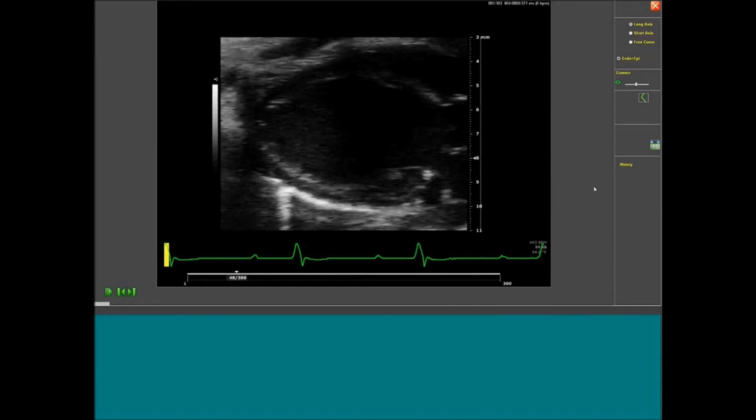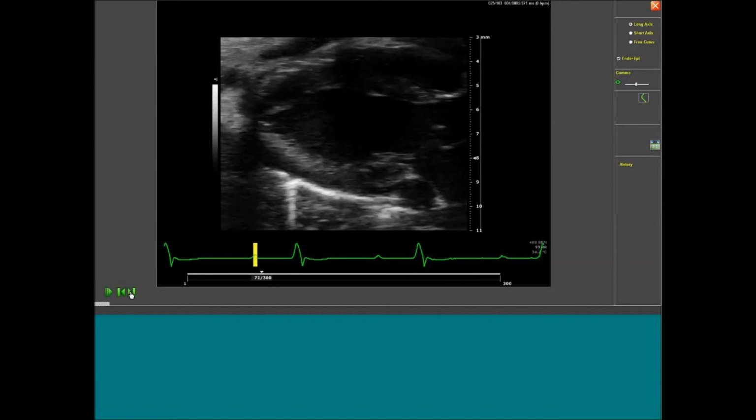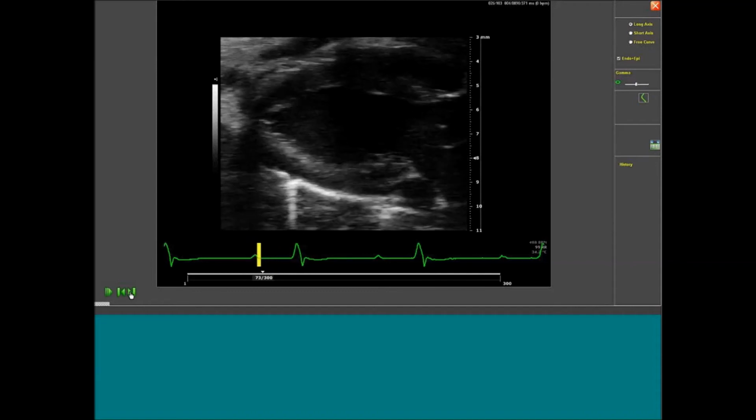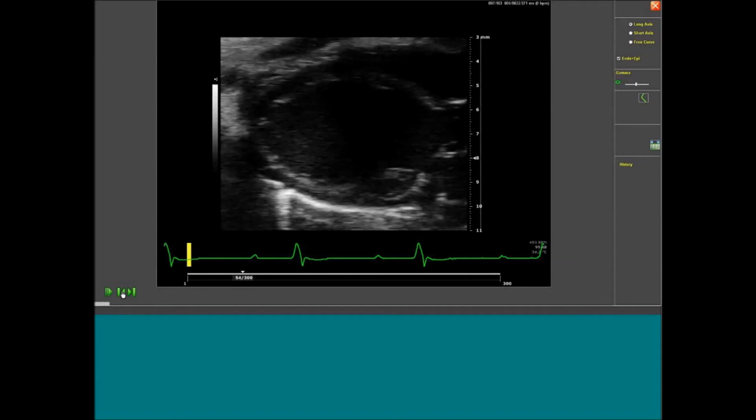Again, those of you who are familiar with Strain will see a big difference here. The tracing screen is substantially larger. Before it was just a small tracing window that was kind of jammed up into the upper corner. And we also have the physio data, the ECG trace from the system here, with a marker showing where we are, so that if you want to do your tracing on a particular point with respect to the PQRST cycle, you can now actually choose a specific point. So if you wanted to trace right off of a particular wave, off the P wave or somewhere else, you're able to do that now, whereas before you were kind of working blind. You really didn't have reference with the ECG tracing exactly where you were in the cycle, frame to frame.